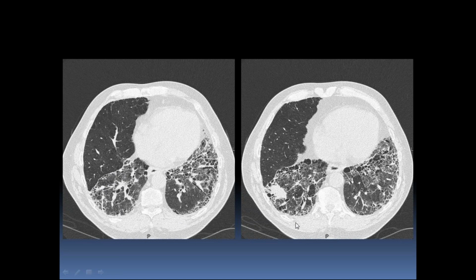So this is a typical pattern of mild UIP, usual interstitial pneumonitis, but one of the things that's going on in this patient is that, because of the degree of inflammation, the cell turnover, and all that other stuff that happens, you have an opacity sitting in the right lower lobe. This was a lung cancer sitting in this patient, so you can always have more than one thing going on, and you just have to make sure that you hit all the possibilities. I think it's a 1 in 4 chance, or just a greater chance of getting lung cancer in these patients.